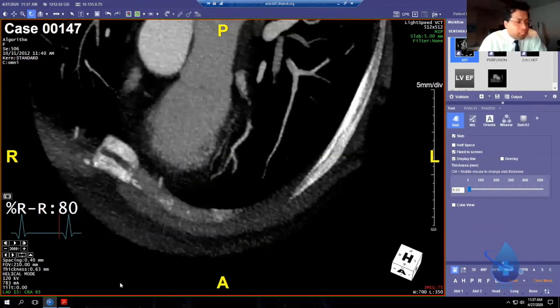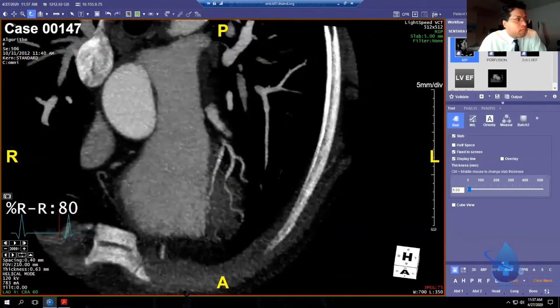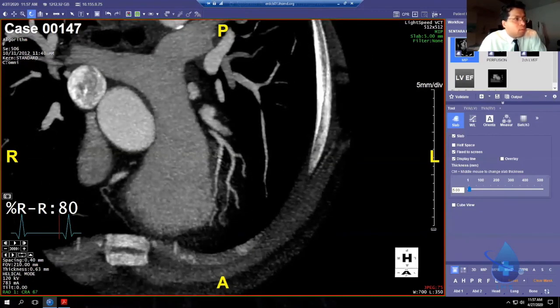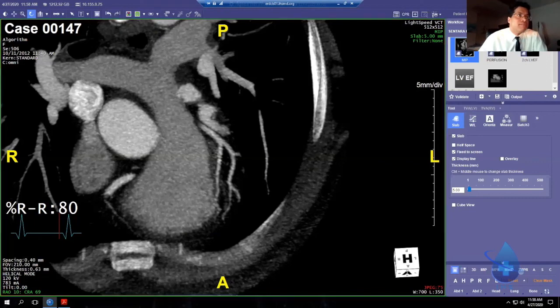So you have to be very discreet with your mouse movement. When you want to line up something, to left click on the edge of the screen is to rotate straight across. Without making a move into the screen, you have to move straight across. Okay, and what that does is it simply takes the on-screen image and it just moves it 90 degrees on the screen without actually rotating into the plane of the thorax, where you're more likely to get lost. So that's what that move is.